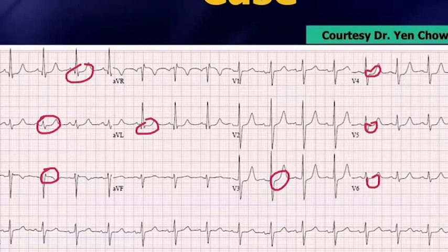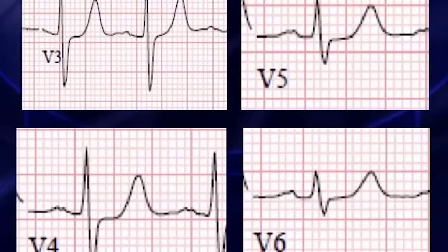In fact, if we take this 12-lead EKG and we blow it up, just blowing up a couple of leads, you can perhaps appreciate the ST segment changes a little bit better. And by the way, in the United States, at least, in this horrendous medical legal system, what I've come to understand is that if you end up in court for litigation for a missed EKG or some subtle EKG, the plaintiff attorneys will oftentimes take that 12-lead EKG and blow it up just the way I'm showing you here.